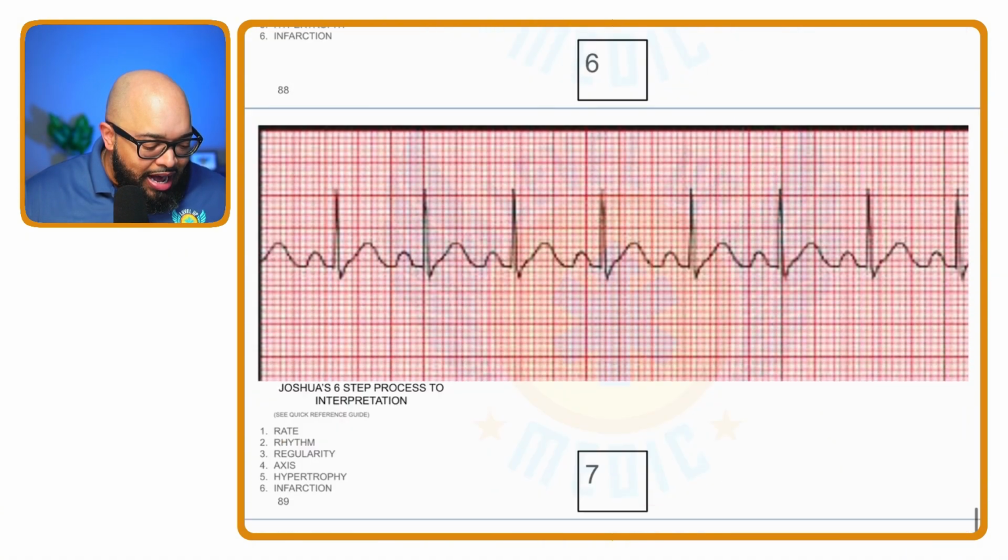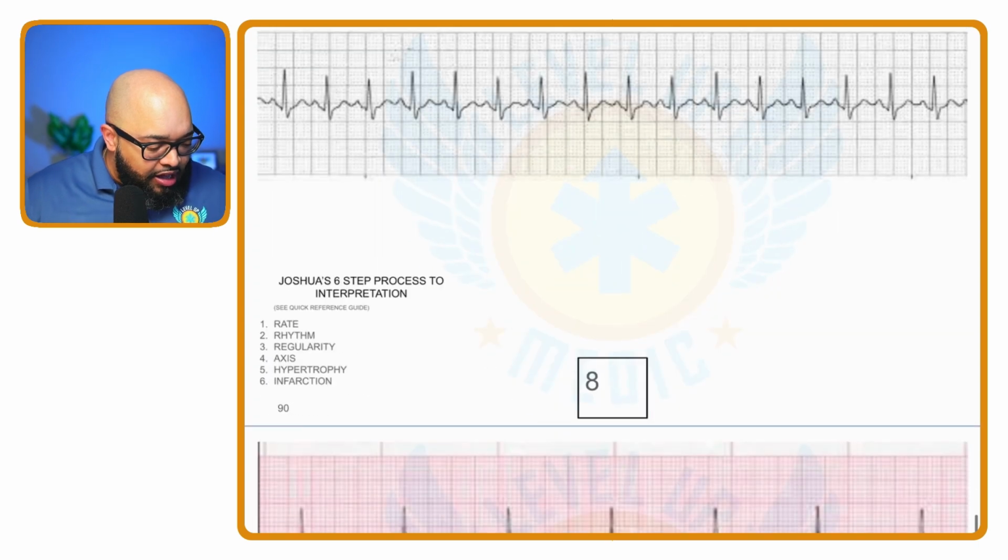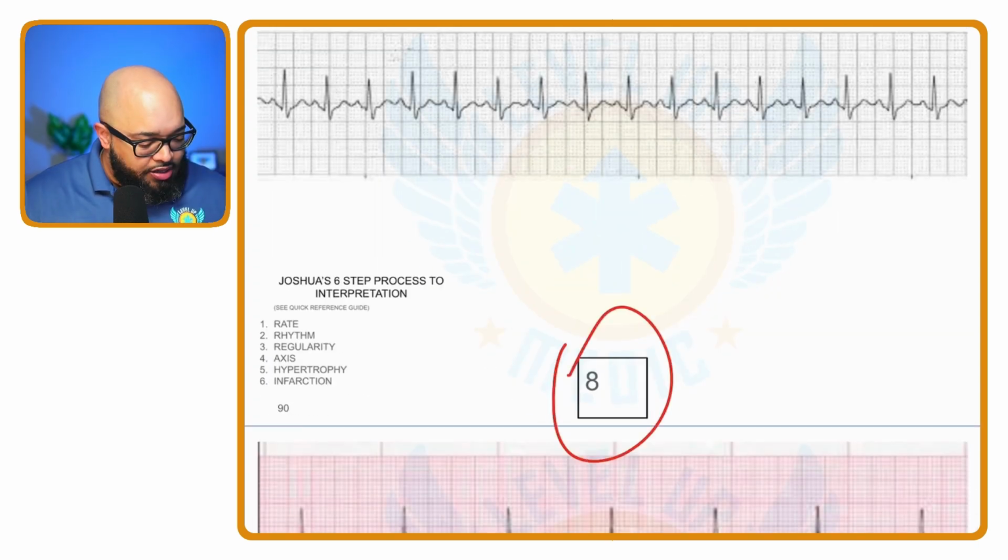But just in the interest of time, I want to skip over some of them. Now, let's go to here. This is number 8. So let's start with number 1, right? We're going to always start with rate.